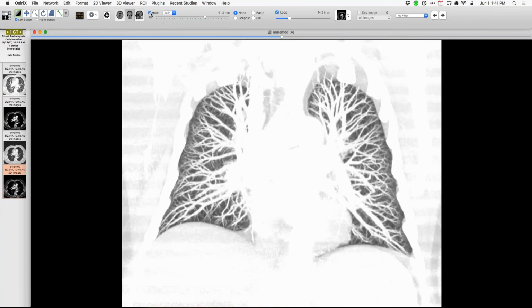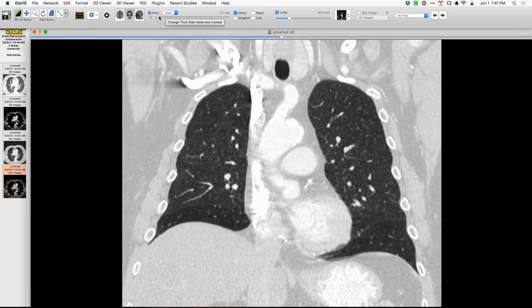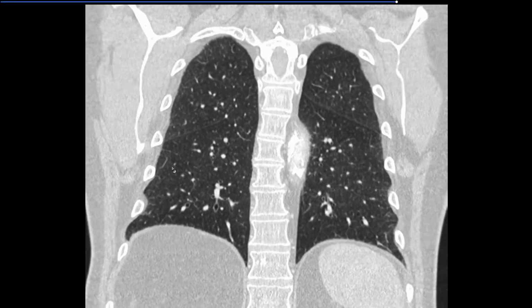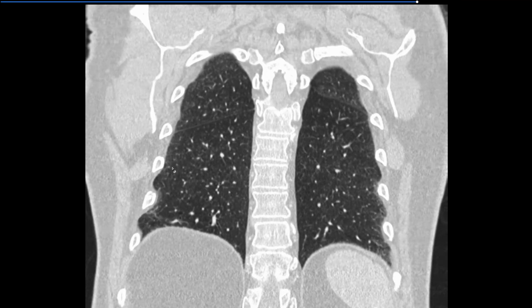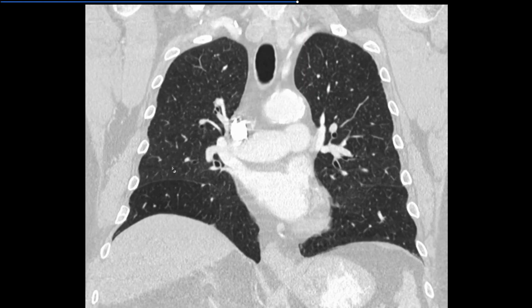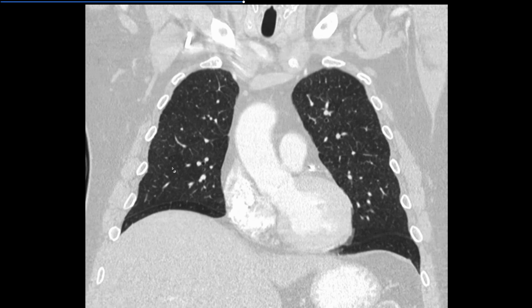Let me make it just a little bit thicker so it's not quite so noisy, and bring this down to around 2 to 3, maybe, something like that. Scroll through there. So yeah, that's really nice. It shows the gradation. Okay, yeah, I think that's very likely what this is, a fairly striking imaging finding, albeit unexpected.